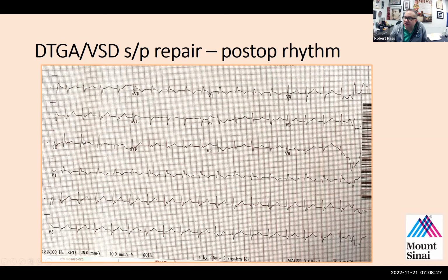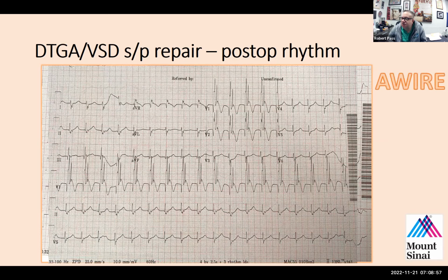If you look here in the inferior leads, you can see what looks like a small P wave after every QRS. Now, how could you confirm that, Tarek? You have a patient who is right after surgery, a couple of hours after open heart surgery. Could you confirm this rhythm in any fashion at the bedside? I think at the bedside, the first thing to do will be an atrial EKG. Okay, all right, we have that technology.